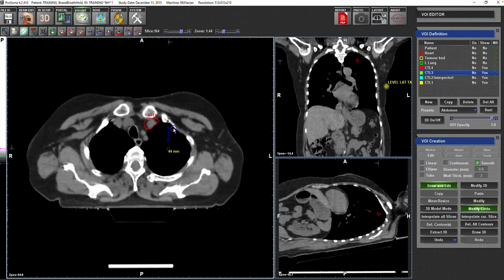All I will do is choose where the space is about to stop, and I will draw the space again medial to the pectoralis minor and the chest wall posteriorly and behind the pectoralis major muscles, and that's it.